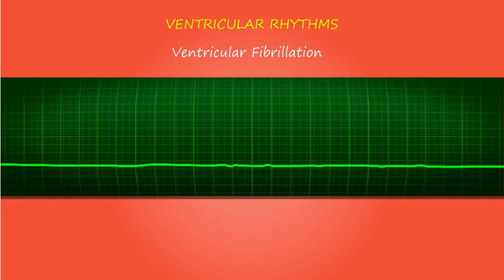And finally, this can be either considered as asystole or fine ventricular fibrillation, almost similar. Very fine activity is seen. This is a natural sequence in ventricular fibrillation.